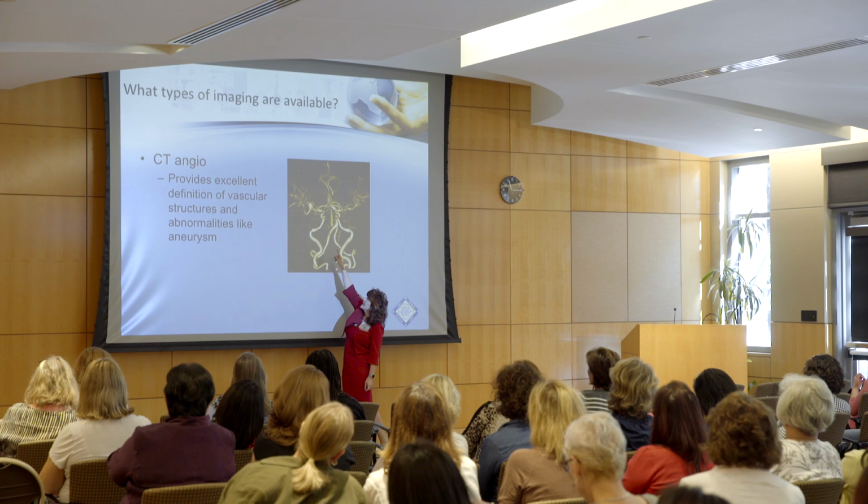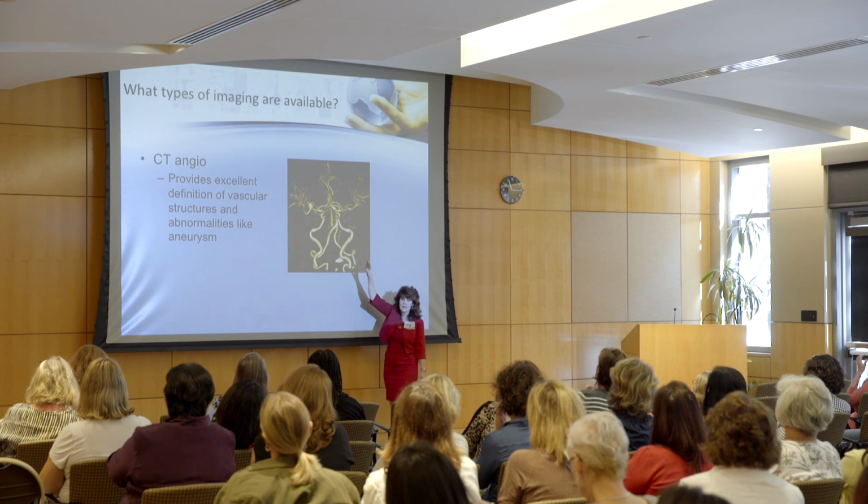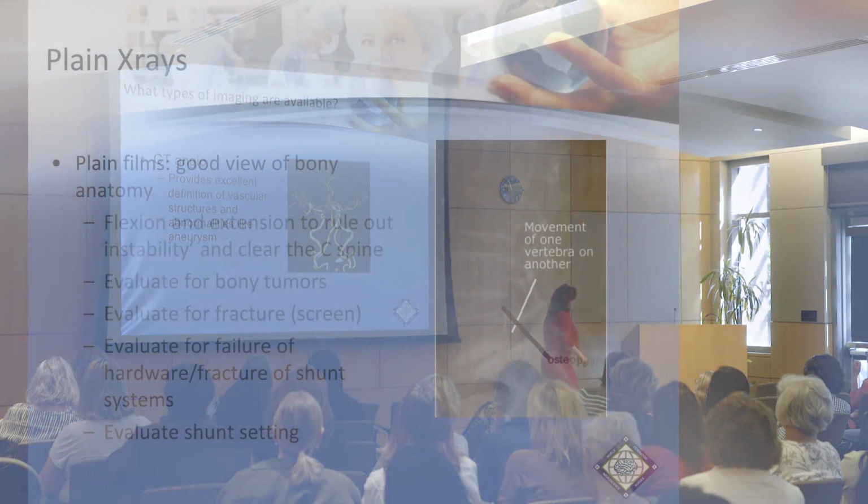There's a big aneurysm on the MCA on that side, and then this is the vertebral as it comes up, and it goes up and forms the basilar, and again, ICA over here in the middle cerebral, and the ones that go straight up are the anterior cerebral arteries.